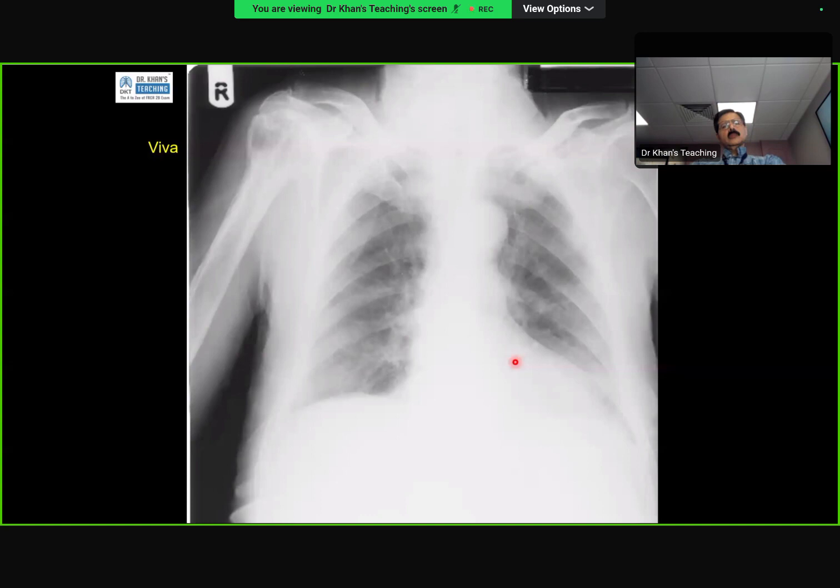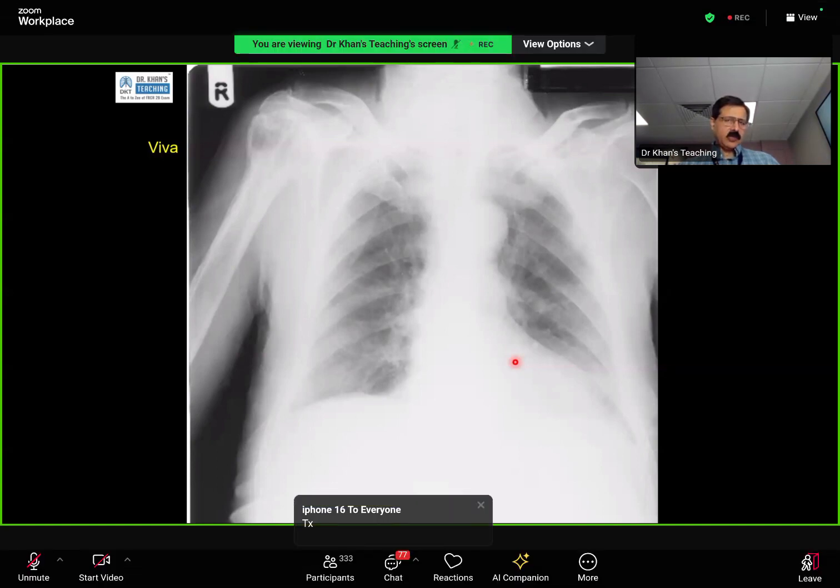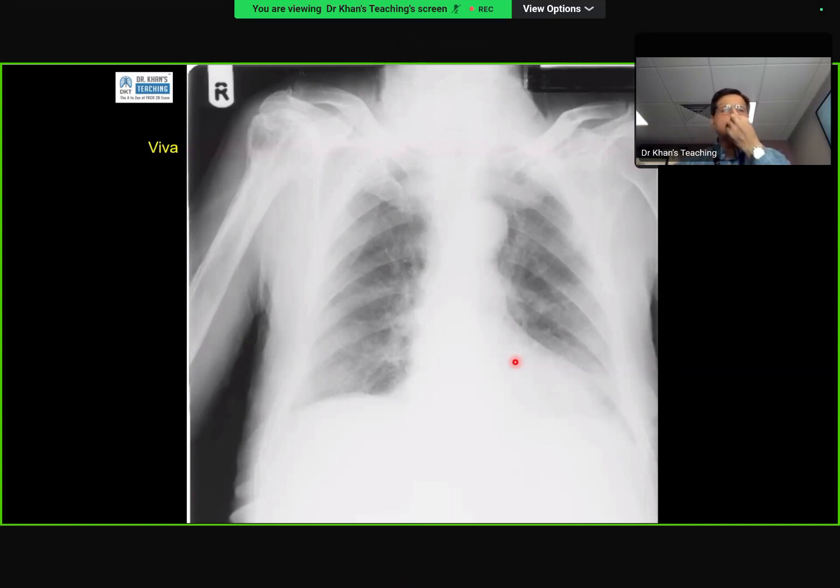I want to see if this patient is a known case of Paget disease. With this finding, it could be representing a malignant transformation of the Paget disease. Patient is asymptomatic as far as right humerus is concerned, no pain or anything. How can you explain that finding? It could be due to radiation, maybe from a previous tumor or something.